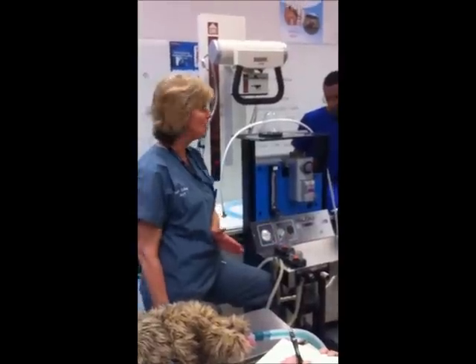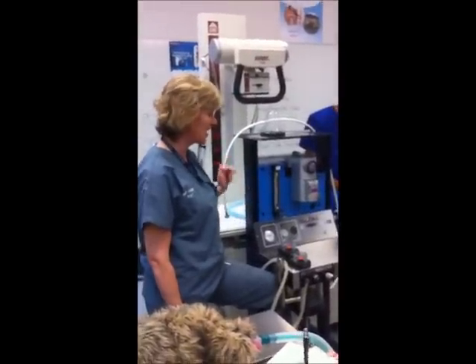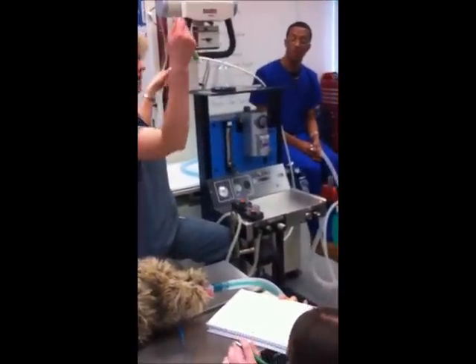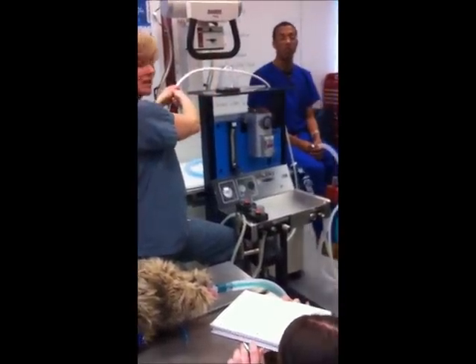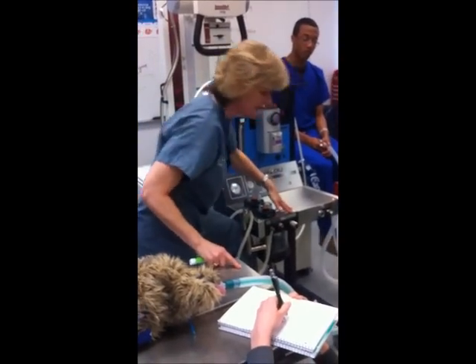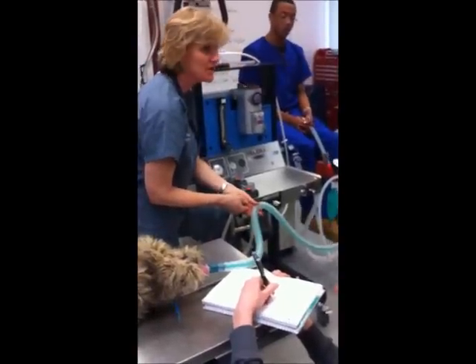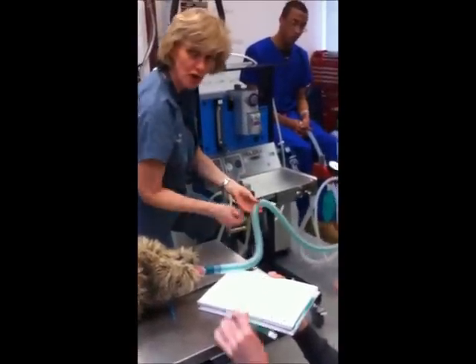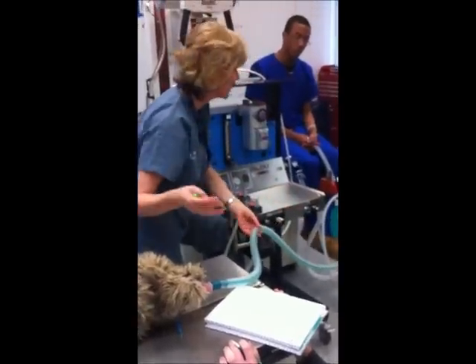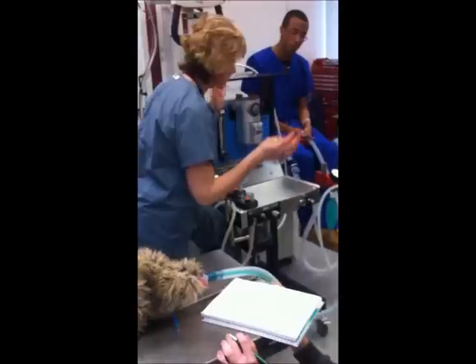those 4 parts. Okay, so if I give you, say, oxygen, pop-off valve, scavenger, and inhalation, you're just going to take the card that says oxygen and hold it up to that. If we get to the inhalation valve, it will be the system you've set up. If there are other students in the room, it's hard for you to hold a card up and me be certain which hose you're talking about. So I may say, what color? I want to be sure that you know which is the inhalation and which is the exhalation.